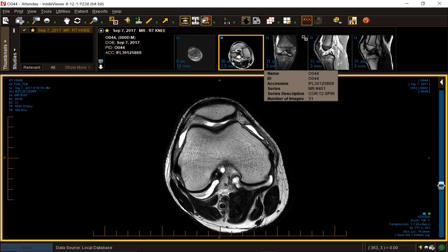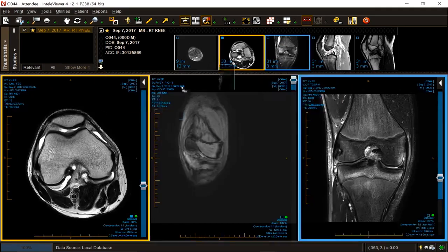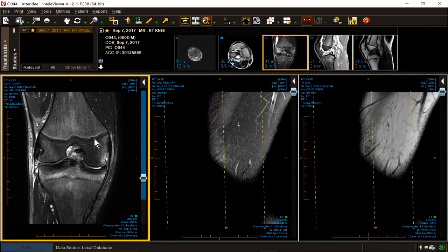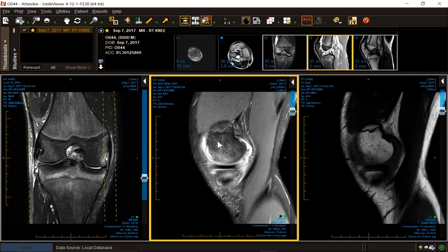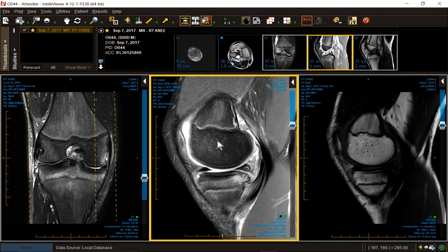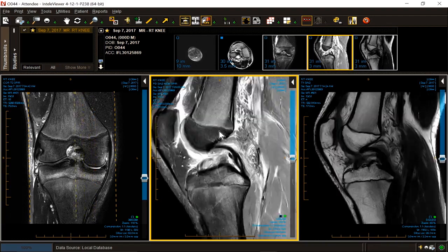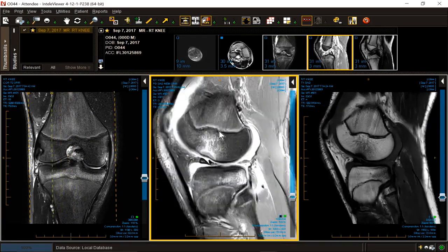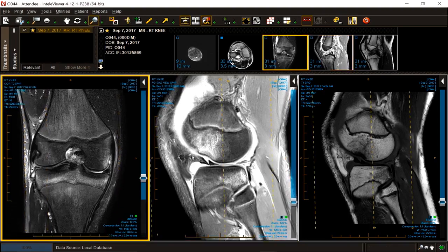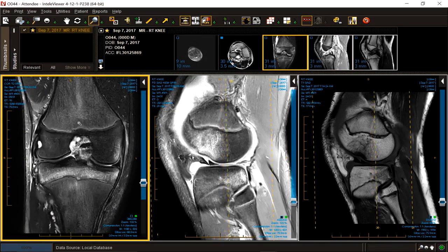Now let's put up the rest of the study. You can see you can get through these pretty expediently. All right, bone pattern. Giving you about 30 seconds to reflect.